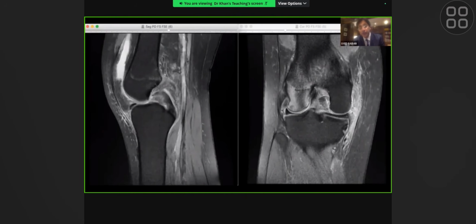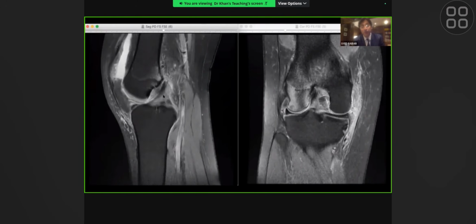Why? Because the mechanism of injury is not front to back. It's lateral to medial. If the force was coming from this direction, you could easily damage your popliteal vessels. But here they're saved because the vector is coming in the transverse plane. So it's coming from the wrong side. So there's no danger to the popliteal vessels here. But of course, it has disrupted the PCL.